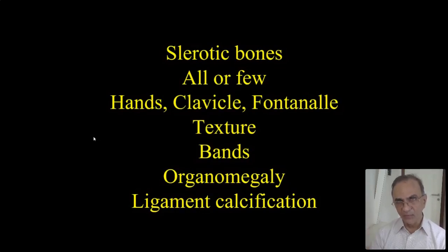The two common ones, what I mean is they are common. The two common ones are secondary hyperparathyroidism, which produces coarse trabecular pattern and increased bone density. Increased bone density in hyperparathyroidism can happen only in secondary hyperparathyroidism, only, no exception. Thank God for that. And if you have ligament calcification in such a setting, you think of fluorosis, only fluorosis. So sometimes life is easy.